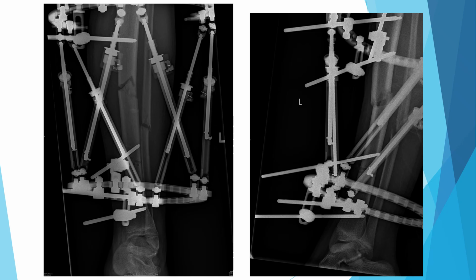And I really regretted this. It took 4 trials. And of course, the patient is in pain, so it's not easy to get the X-ray. And I had to have one of the residents be there to make sure that we get the frame, and we were able to do the program. So always try to get the X-ray in the OR while the patient is asleep, and you can look at them and make sure that you can see the frame and you can put the program.